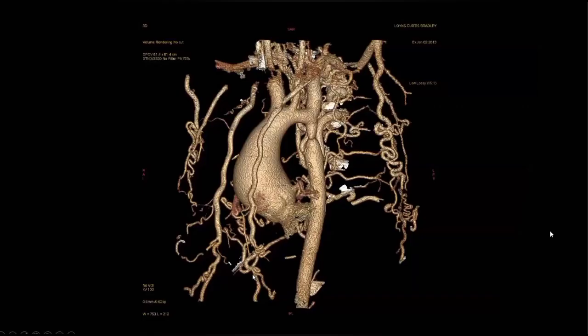So what do you think now? Post-ductal coarctation of aorta. No, please try to take up the image like what it is. Make it a habit: what is this, what is it showing? I know that there's coarctation of aorta, but there's one thing else. And what type of image is this?